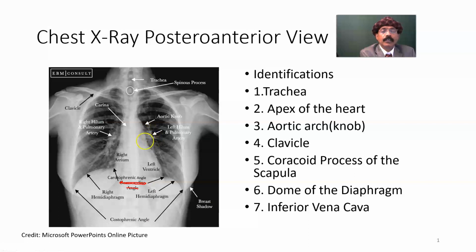These are the pulmonary artery and pulmonary vein. They are the contents of the hilum of the lung. So pulmonary artery and pulmonary vein are contents of the hilum of the lung. Okay, we got that. Then the clavicle.